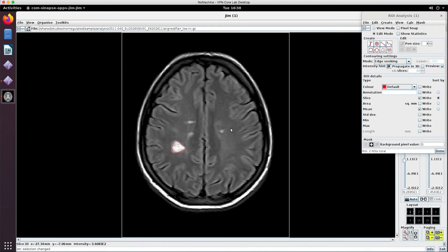The basic idea will be that we want to proceed through every slice one at a time and do these ROIs. And we'll move back and forth as we go along to get a clear picture of the anatomy. Usually you want to go a couple of times up and down through the image. We may want to look at the ortho views, look at different intensities, but that's the general process. And you'll gain experience as you move through looking at different cases.